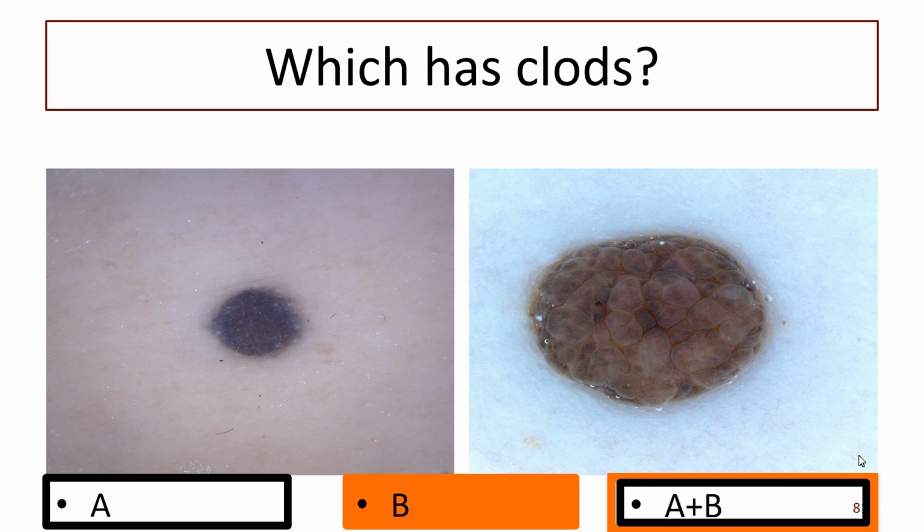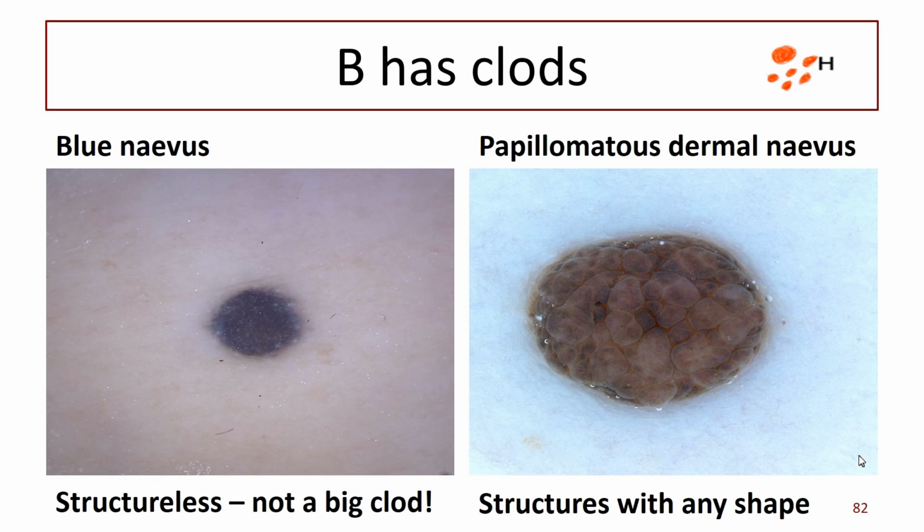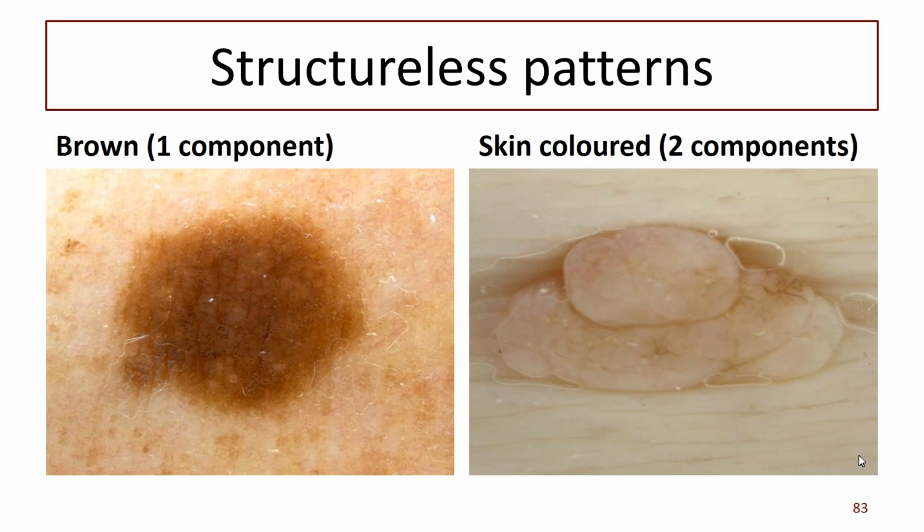Probably you were all terrified by Peter Sawyer showing you a cellular blue nevus that turned out to be a melanoma. Look, that's as rare as hen's teeth. Don't worry about it. Most blue nevi are easy. They just look like that, and they stay like that.